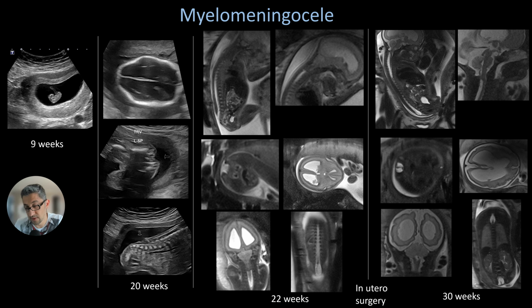And this is the repaired spinal defect, and ventriculomegaly still persists. Cysts, and we are now able to see these subependymal gray matter heterotopias. And so this was a significant improvement after the surgery.